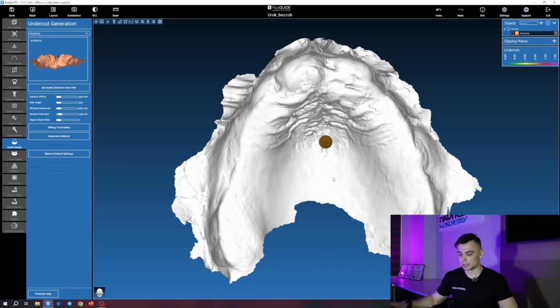So, what exactly is that? A radiopaque guide, let me say right away. Let's first talk about the overall process.